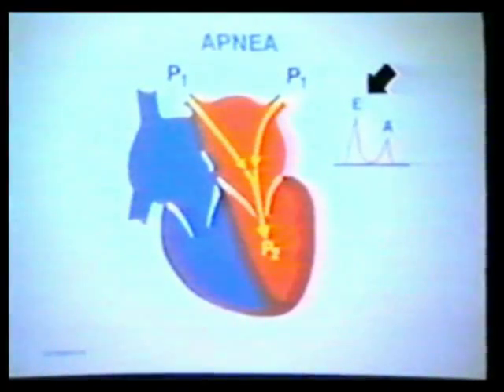The mitral velocity reflects the pressure gradient between the left atrium and left ventricle. And since there is only a small gradient between pulmonary veins and left atrium, we use the mitral velocity as an indication of the gradient from the pulmonary veins to the left ventricle. It is important to understand how this filling gradient is affected by respiration.